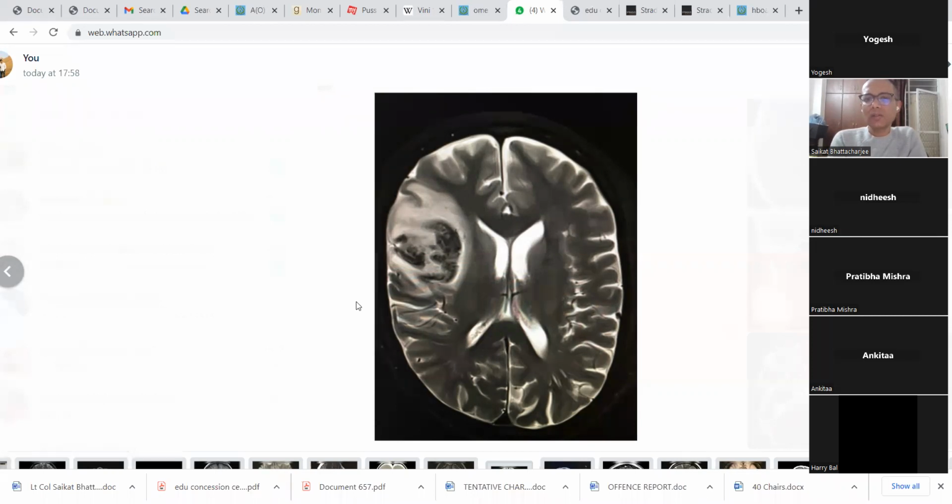Sir, glioblastoma. Could be metastatic also. Yeah, metastasis. You should think of a metastasis. A hemorrhagic metastasis is so much more common. Then yes, a GBM, that is a glioblastoma multiforme, or a high-grade astrocytoma, may have a bleed within it. Okay. Anything else?